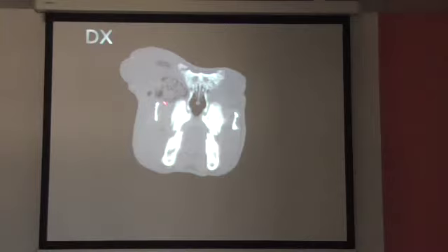And if you go for the CT, you could see again a lot of radiolucent areas. Exophthalmos. So it means that there is a retrobulbar abscedation, with bacteria which are producing gas.